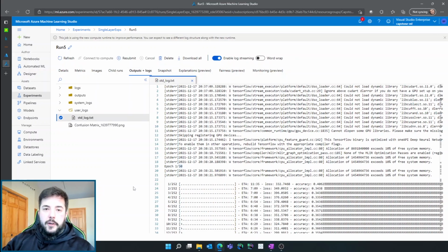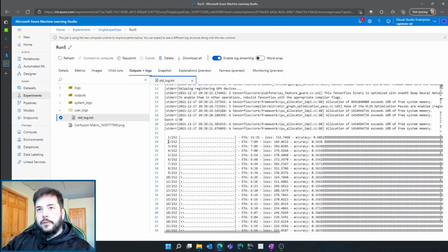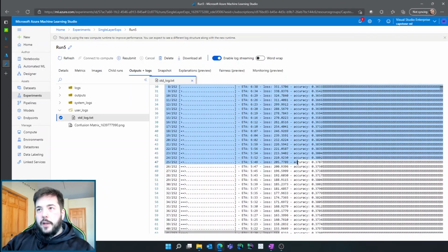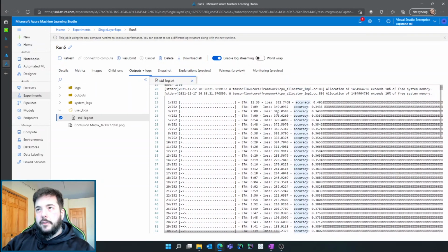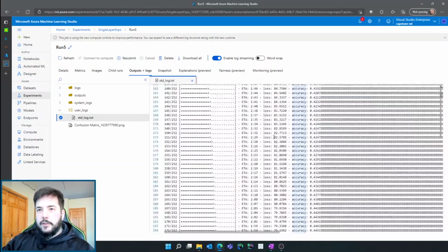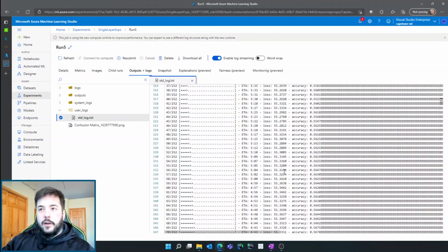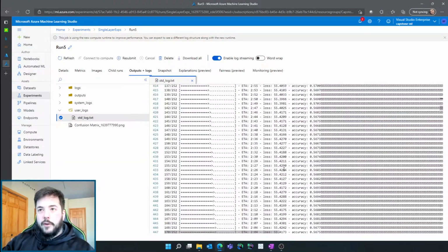If you're using a training cluster, you don't have direct console access to it, or you can't log in to see what you may be used to seeing if you run training through a standard notebook. So in this case, you can actually view the output logs. Here you can see my first training epoch, right? You can see the training loss and the training accuracy as it goes through the different images that it's testing on. Then we tied off epoch 1, and it tests the result of that epoch against my validation data. So my validation loss, my validation accuracy, right? So you can see what you're used to when you run TensorFlow training on models.